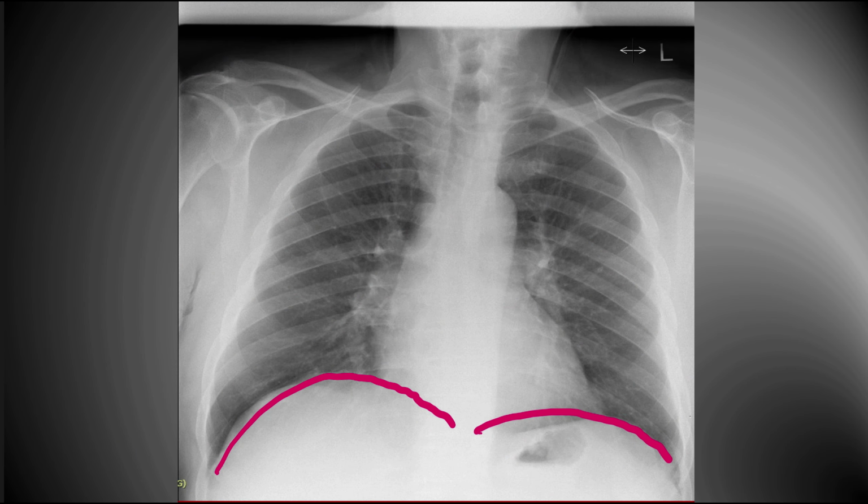The only way of being certain of correct placement is to perform a chest X-ray, particularly imaging the upper abdomen. Helpfully, the tip of the tube is radio-opaque. The ideal location of a feeding tube is down the midline and into the stomach. If the tube has not passed beyond the diaphragm, you have to assume that the tip is inside the chest.